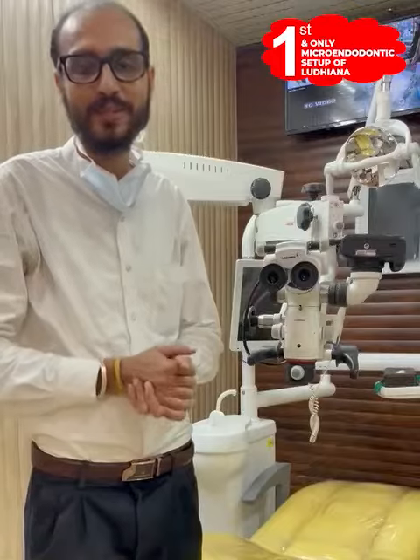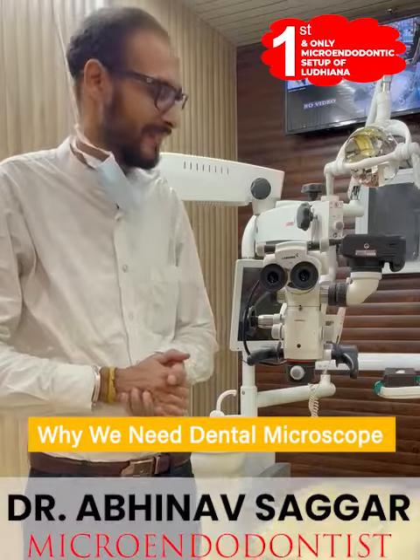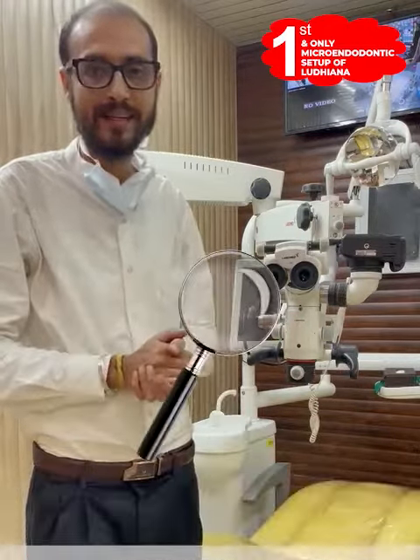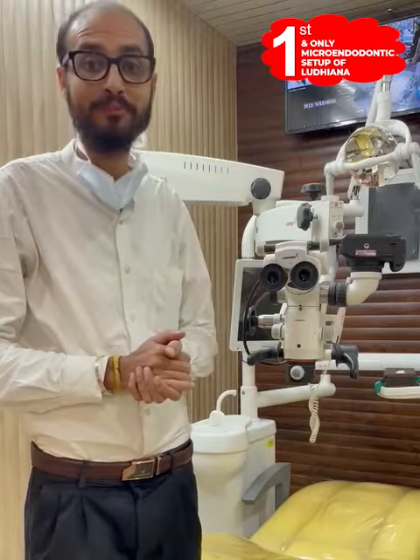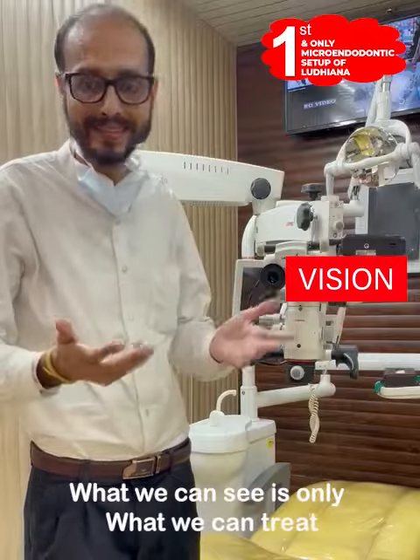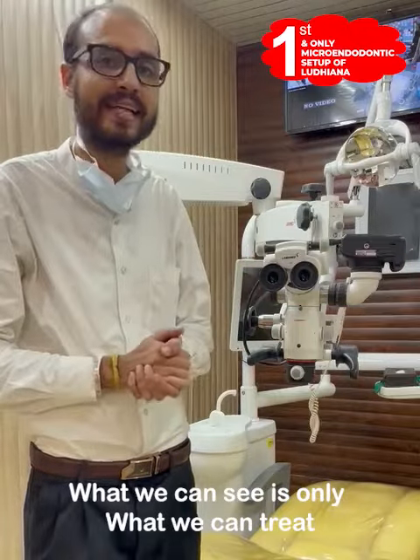Hello friends. So why do we need a microscope? A microscope, like we used to study in our schools, magnifies, so it has many advantages. But the most obvious advantage is vision. What we can see is only what we can treat. We cannot treat the things we cannot see clearly.